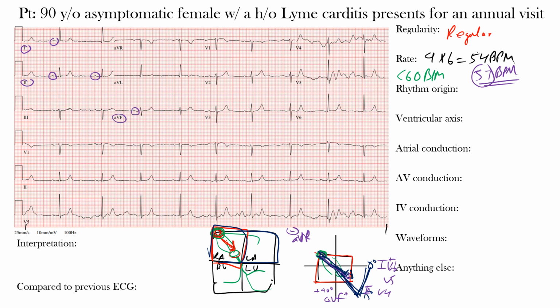Here's an upright P wave and another one there. And then if we look at those left lateral leads, well, V4, there's a lot going on here that we'll talk about later, and same thing in V5. In V5, you might be able to make out this P wave maybe here, but maybe not actually. But V6 is a lot more clear. You can see a P wave there and one slightly showing up there.